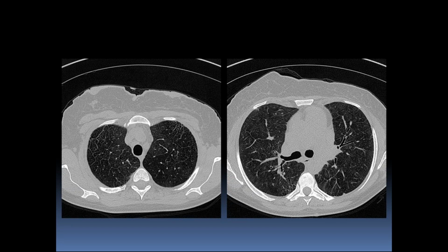And so you can say that this is likely from a high-resolution exam and performed in the prone position. That'll catch their ear a fair amount just because they'll figure that you know what you're talking about.